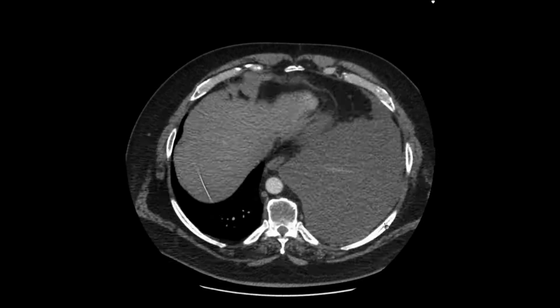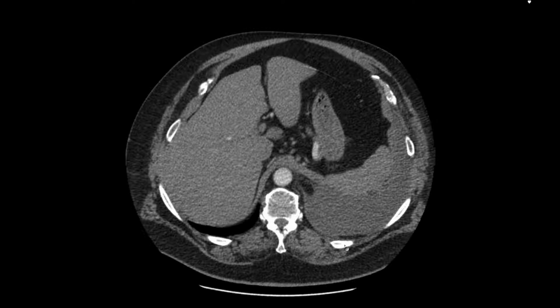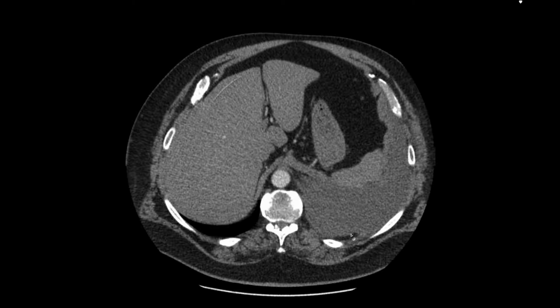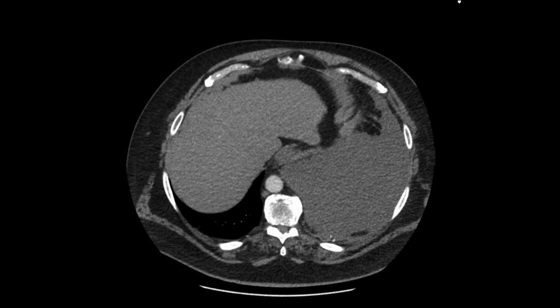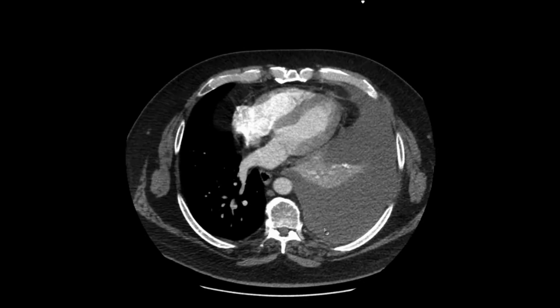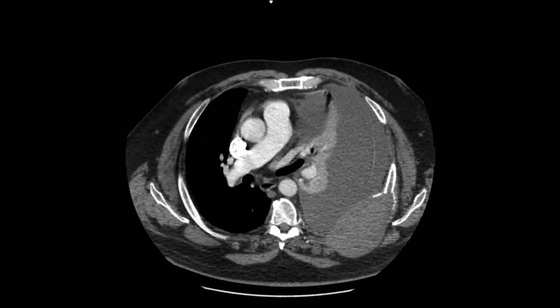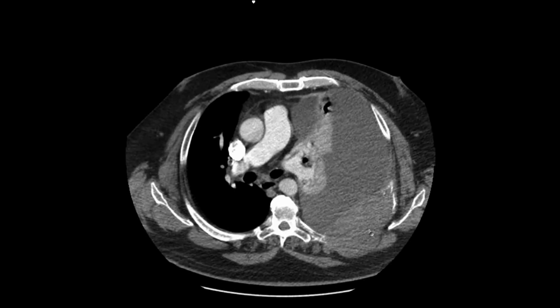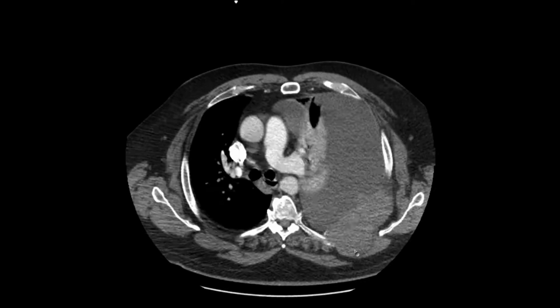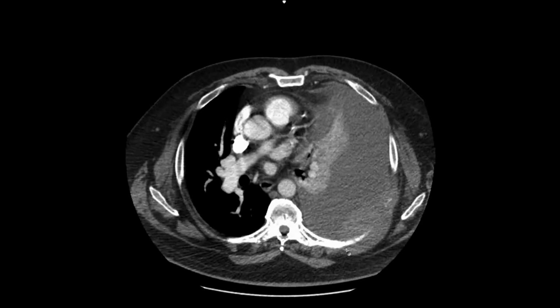And I just want to look further down to see whether on this image, perhaps on a follow-up, which I'm not showing you, in relation to pleural surfaces down here, which is not there, there were small areas of high attenuation. So this turns out to be a so-called telangiectatic osteosarcoma. And certainly one form of osteosarcoma that can produce a large mass and arise within the rib. And those sarcomas, osteosarcomas, need not have a lot of osseous matrix associated with them, even though this tumor is very big. But that's what this is.